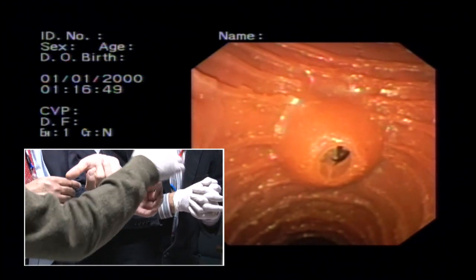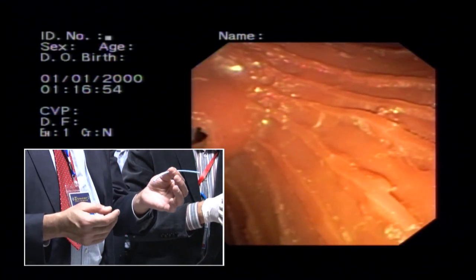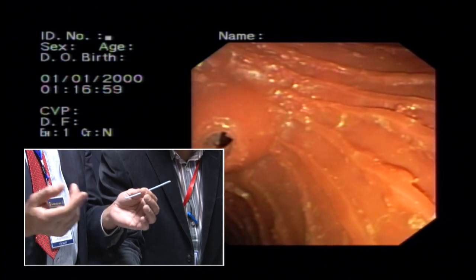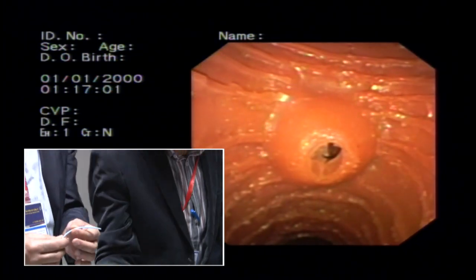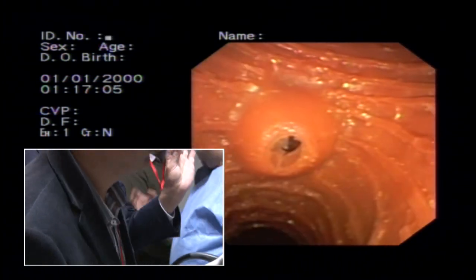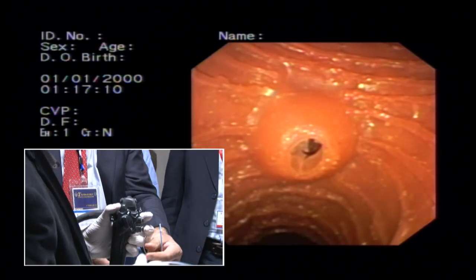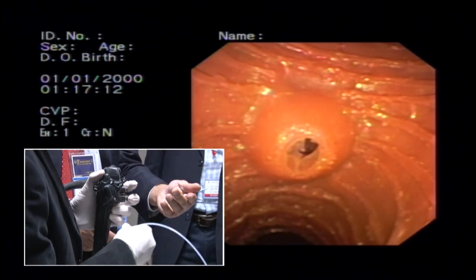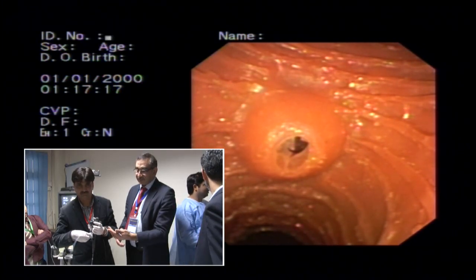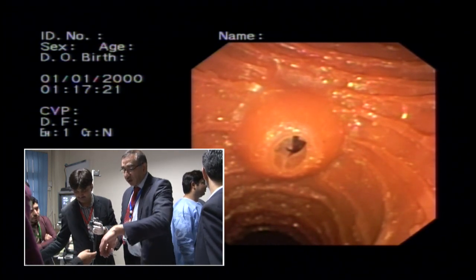सर ये ड्यूडिनम में होगा, ये CBD। इसी तरह आप मल्टीपल चॉइस क्वेश्चन बनाते हैं, आप कोई क्वेश्चन पूछते हैं तो एक A जवाब देता है, दूसरा B देता है, तीसरा C देता है, या होता है none of the above या all of the above, ठीक है। तो अगर आपने पता कर लिया था कि कौन सा अंदर है कौन सा बाहर है, आपने इसको स्टैंट असेंबली में डालना है, ये निकाल लें डॉक्टर साहब। तो उसमें कौन सा कैसे डालेंगे इसको? ड्यूडिनम वाला पहले जाएगा, ये ड्यूडिनम वाला साइड है, तो ये आगे होगा कि पीछे होगा?